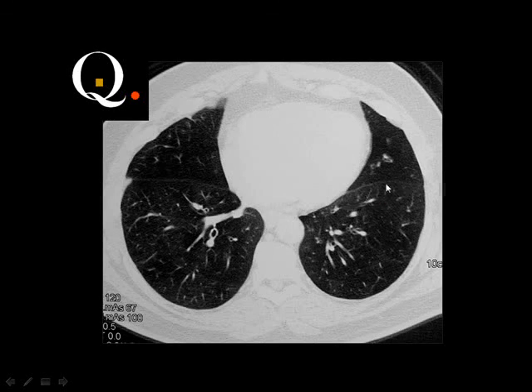Then, can you see the fissure? And this is the fissure, dividing an anterior 1/3 and posterior 2/3. Then, what do you think of this area? Medial segment of the middle lobe. Then, anterior of the right lower lobe, anterior of the left lower lobe. Then, superior segment, the superior is close to the chest wall, the superior segment of the lingula. And here, medial segment of the lower lobe.